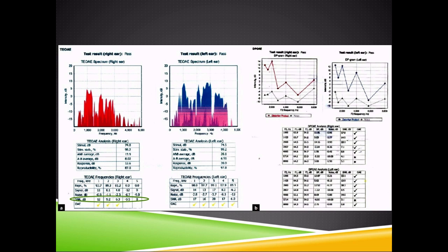And you can see, and this was done as sort of a screening, when you look at the SNR values, where it's 6 and above, they get check marks for essentially passed. Same thing over here, where it's 6 and above, they get check marks for passed. In the DP side, you have the same column. It's portrayed differently, but above you still have this line chart where you see the DP and then the noise floor underneath it, and then a table displaying the actual SNR values at each frequency.